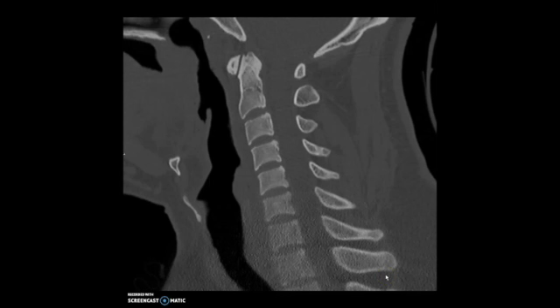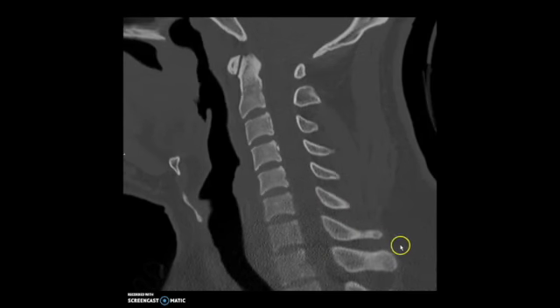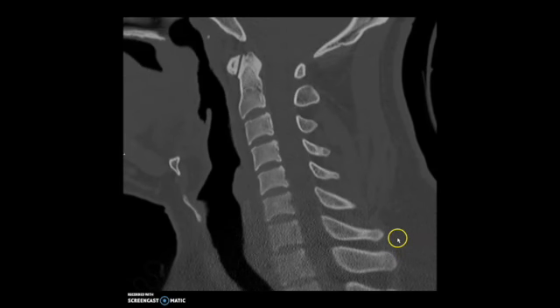And this is actually really useful sometimes when you have an MRI of a thoracic spine and you don't have a good localizer to count down from C1. If you just need to guess, at least to get a ballpark level of which thoracic vertebral body you're at, if you can see the lower cervical spine and you can see this transition, you'll know that this is T1. So I can show you this on another CT as well, maybe a patient with slightly different anatomy as an example.